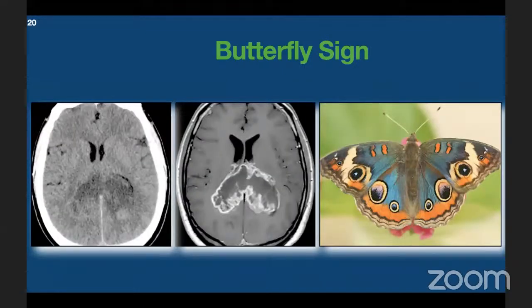Butterfly lesion can also involve the splenium of the corpus callosum. The CT scan here is showing an ill-defined non-homogeneous hypodense lesion, and MRI after gadolinium showing the thick and irregular periphery. Also, you can see both the solid and cystic component of this lesion.